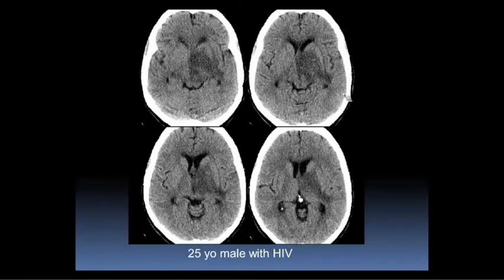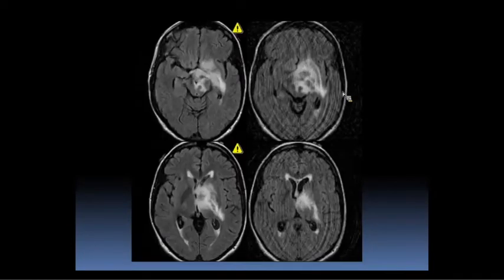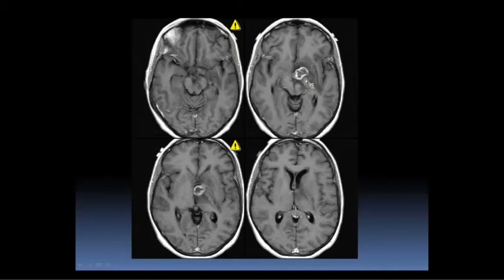And if you remember, the lymphoma has a different appearance in the HIV patients. So this is an MRI FLAIR image. And you can see that there's edema and mass effect as we suspected on the CT, and then there's a ring-enhancing lesion here, and the differential for this would be toxo or lymphoma. And lymphoma can look just like this in immunocompromised patients. In an immunocompetent patient, they always look homogeneous and will not have this kind of necrotic appearance. But this turned out to be toxo.